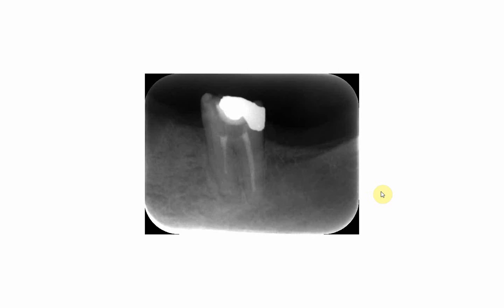This is another case for an amalgam filling. Of course, it's a defective filling, but this is not our topic now. What we want to know here is the radiographic appearance of the amalgam filling. Here, you can see that there is a DO filling in this apparently lower 6 or 7.